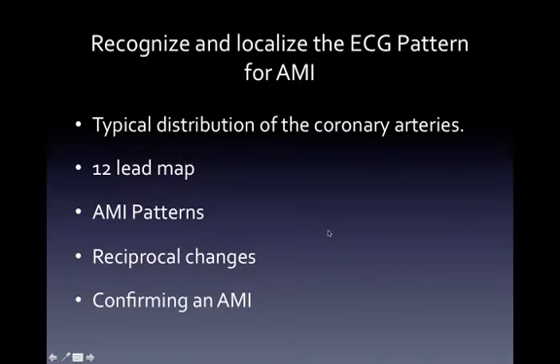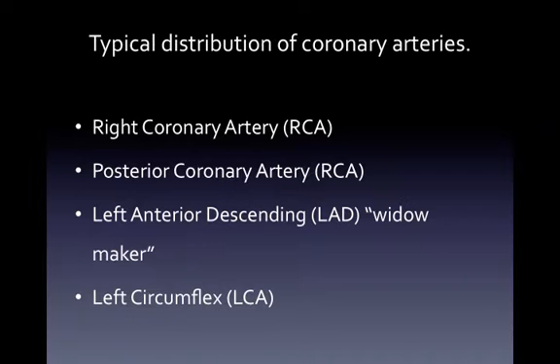Recognizing and localizing the EKG pattern for an acute myocardial infarction. We're going to talk about in this section typical distribution of the coronary arteries, the 12-lead map, acute myocardial infarction patterns, reciprocal changes, and confirming an acute myocardial infarction.